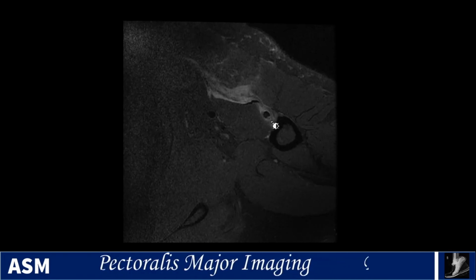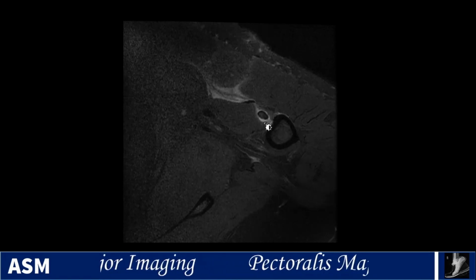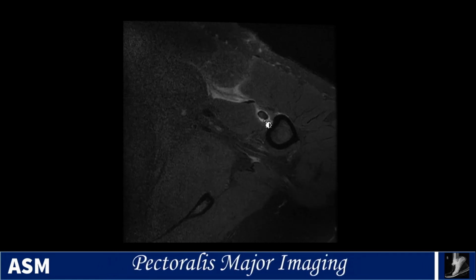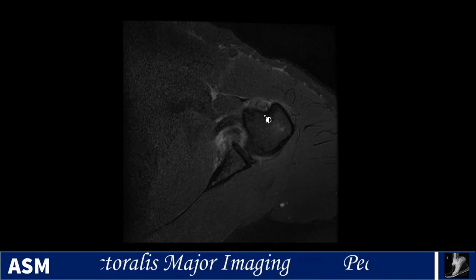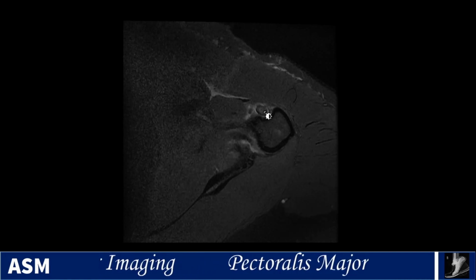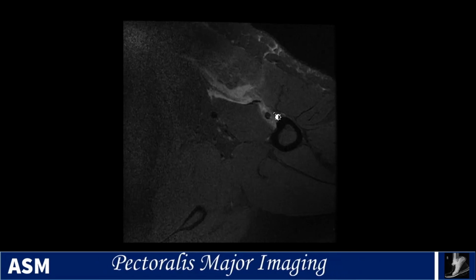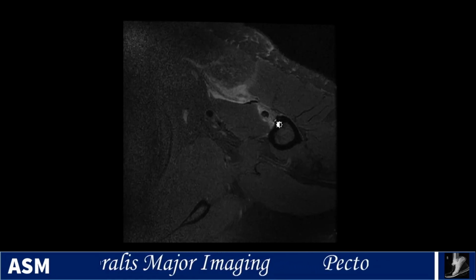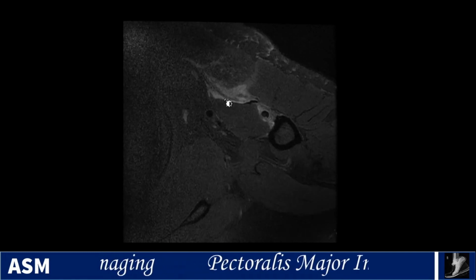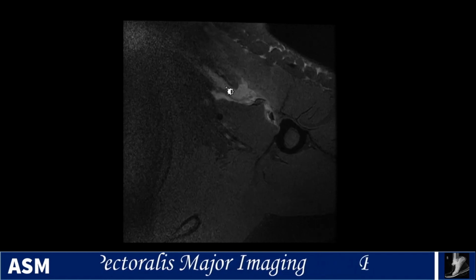And one final case here, we again see the elevated biceps tendon, the fluid around it, but something a little unusual about this biceps tendon, it looks pretty big and somewhat wavy. So you can have other injuries that occur and it's not just the pec, and so this was a biceps rupture that's retracted. There also is a pec complete humeral tear as well, though there's no tendon attaching here. You can see the hematoma back here and some retracted tendon and muscle back here.